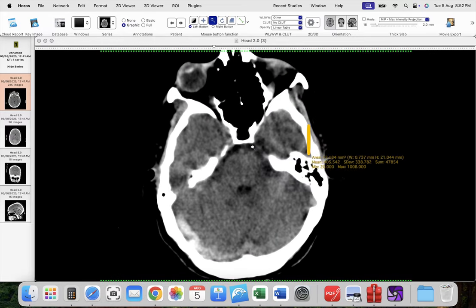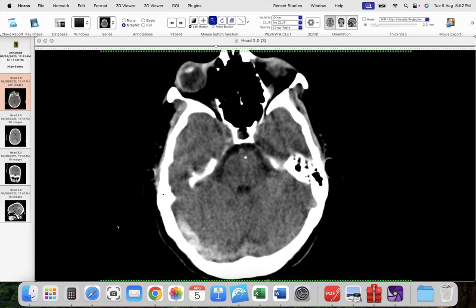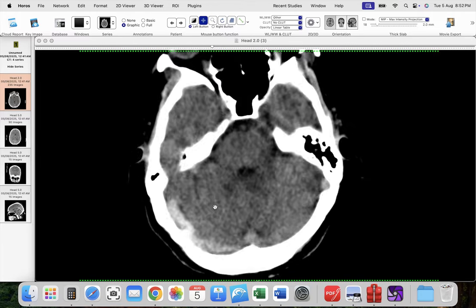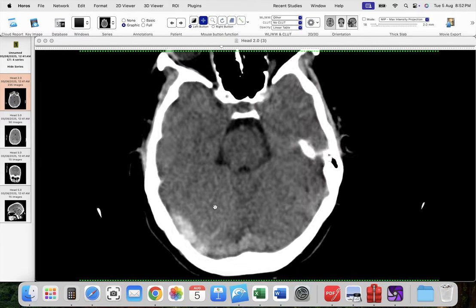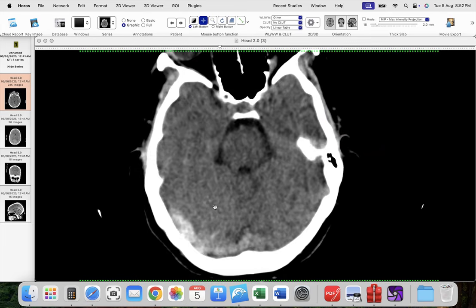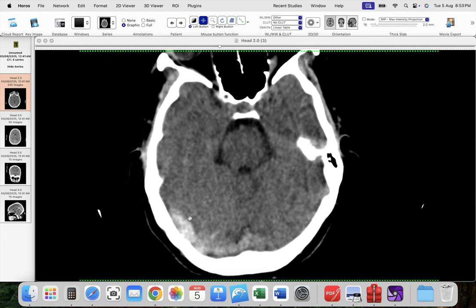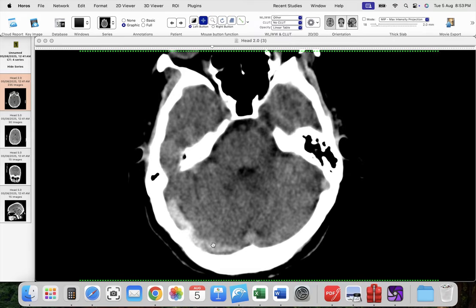However, the junior radiologist urgently notified me to assess the study urgently to report it, and he was suspecting a subdural hematoma, keeping in mind that there is hyperdensity along the right side of the occipital fossa.